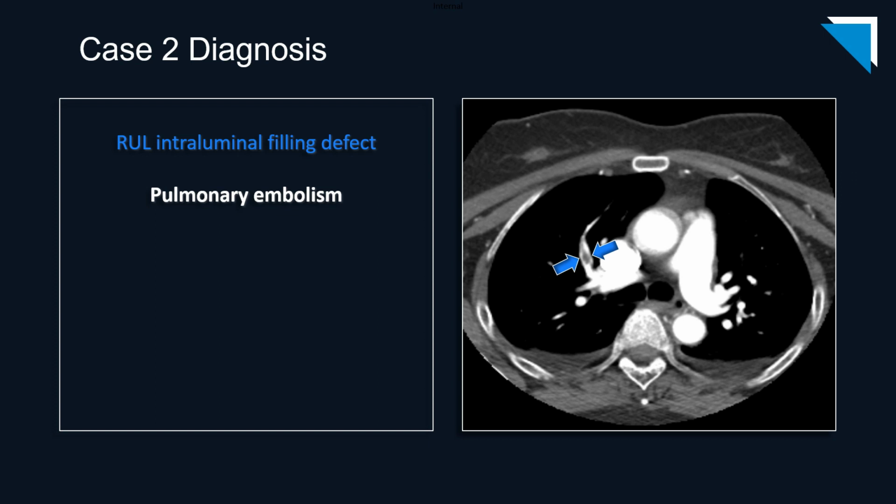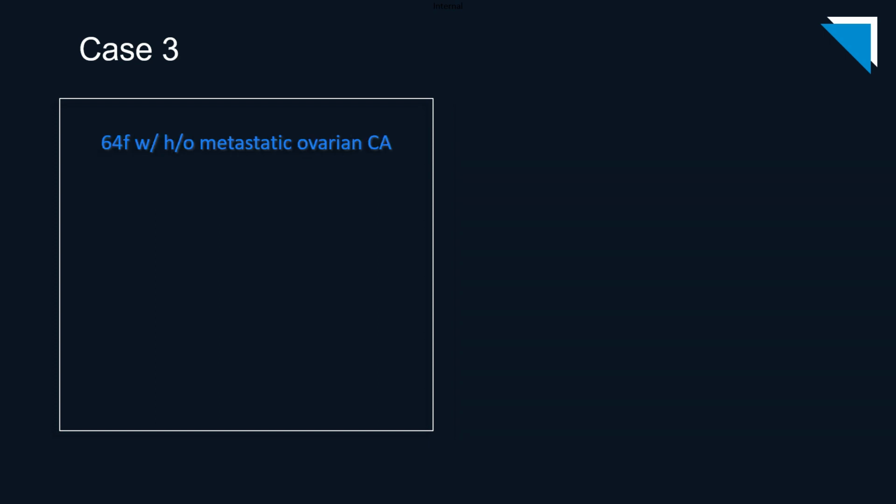Note also that there are small bilateral pleural effusions, and remember that when we're reviewing CT scans of the cervical spine or CT angiograms of the neck, we should always review the upper chest in the lung windows and the soft tissue windows, otherwise important findings could be missed.